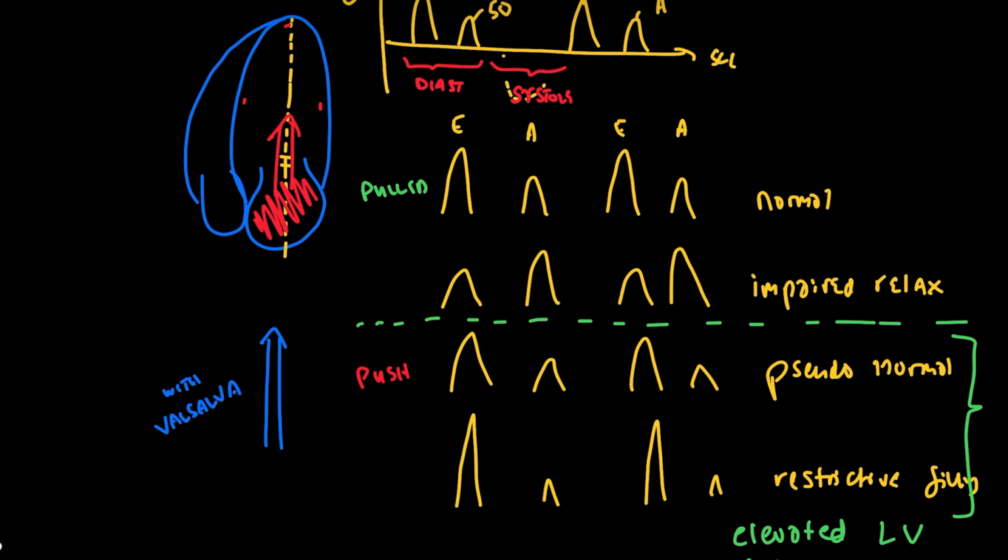The reason I've kept this screen up is I want to show you how we can put together our tissue Doppler and our mitral inflow for some very useful information. And so let me just clean this up a little bit here. We'll remove this with Valsalva. And what I'm going to do is actually draw in the tissue Doppler in blue. I hope this won't become too busy, but so right down here.